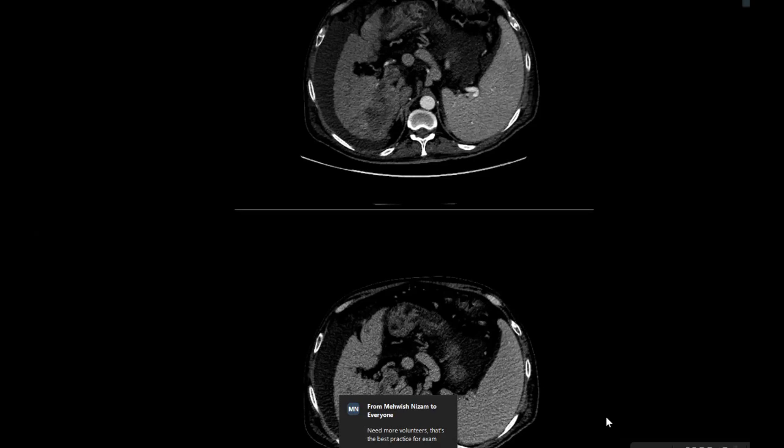This lesion is hypodense on the pre-contrast enhanced images. And so considering the background of the cirrhotic liver and CLD, I will consider this as a... Sorry? What is the pre-contrast? Sorry, sir? Where is the pre-contrast study?